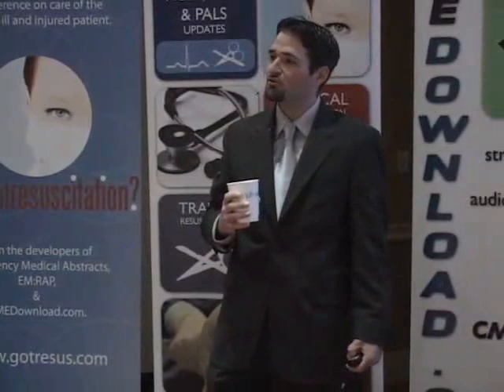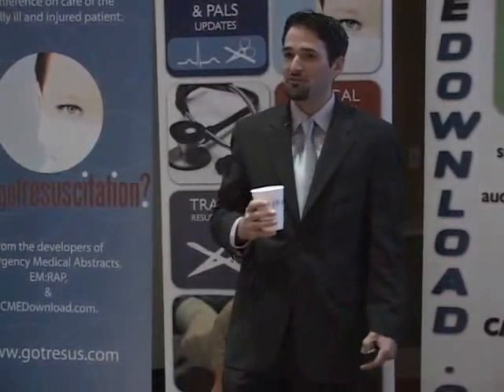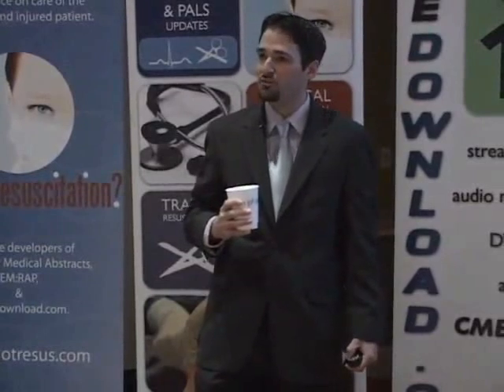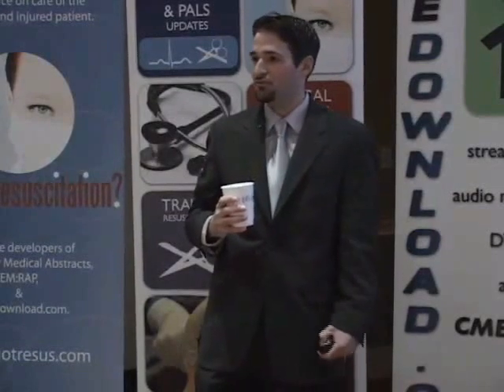If you happen to pick up a AAA, again, assume that it's the cause of the symptoms that prompted you to look in the first place, and assume that it's serious. Get your consultants involved. If after the evaluation it's determined that it's not the cause, then they'll need to be referred. And generally, if the AAA is between 3 and 4.5 centimeters, they'll need serial checks every 6 months. If it's greater than 4.5, then refer directly to vascular surgery, and they can fix it.